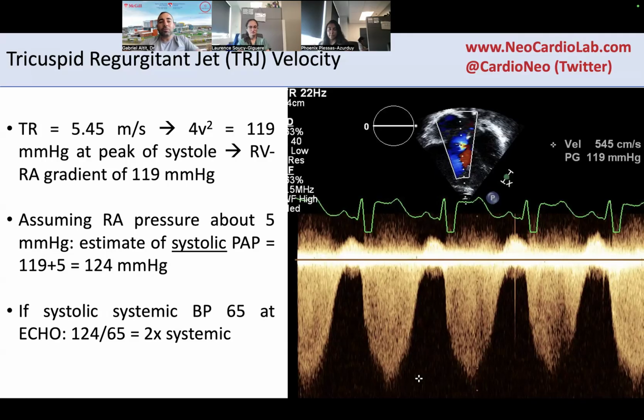The other thing is, for example, if you see vein of Galen malformation or hepatic hemangiomas that have huge flow through these lesions, they typically will have very high flow towards the right atrium. And if you put a UVL in these patients, you'll see blood coming back and back.